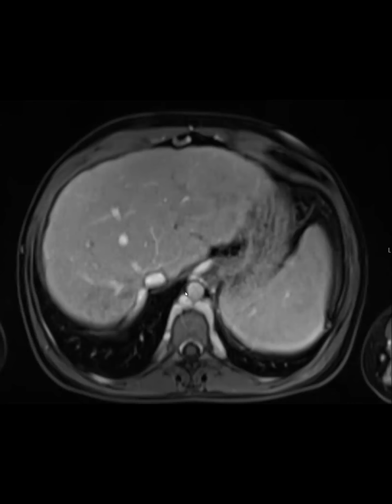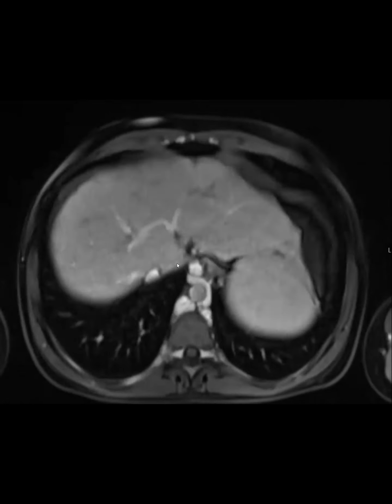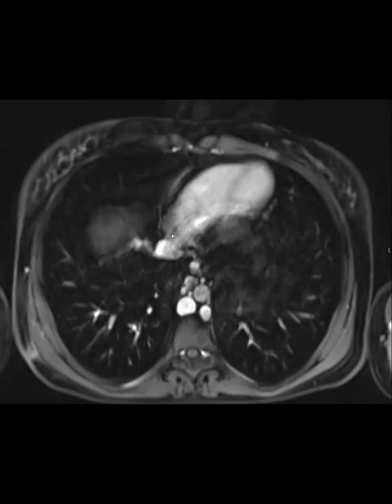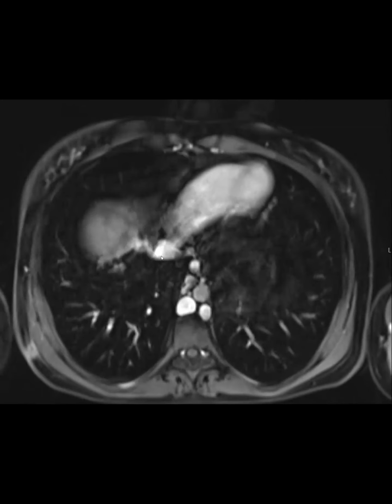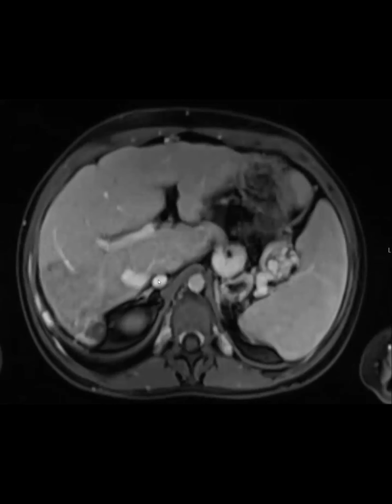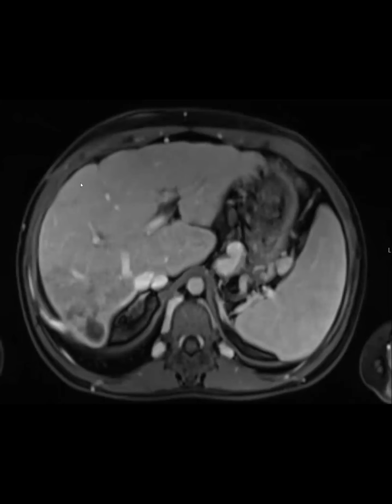So they ended up having to call in vascular surgery to create a de novo IVC to sew to. The IVC kind of comes back here, so there was a snippet of it going into the right atrium. The vascular surgeons had to reconstruct an IVC connection between this and the infrahepatic IVC, and then they plugged the liver transplant into that. Yeah. They would have liked to have known that.